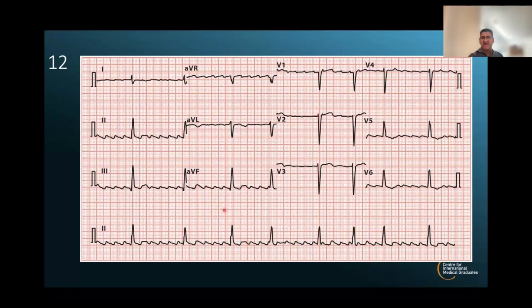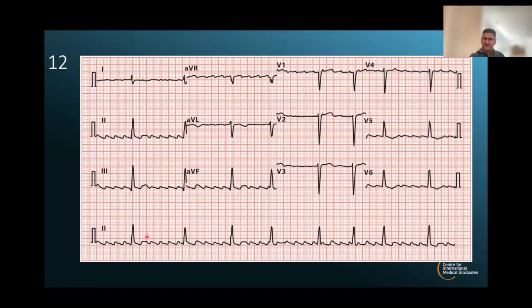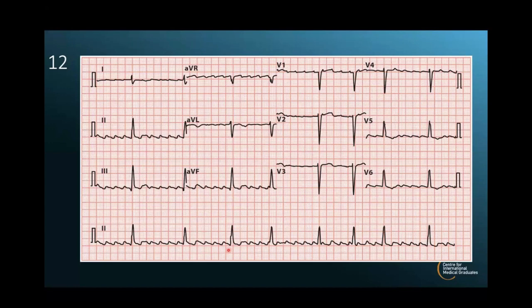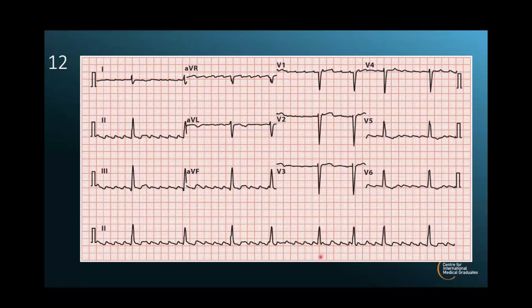It looks slow. And I would say to you, if it's flutter, which you've said, what else can you say about it? You mentioned the word blocks before. What would you say about it? Let's say you just look at rhythm strip 2. Yeah. Well, I think you would expect flutter, the heart to be running fast, wouldn't you?